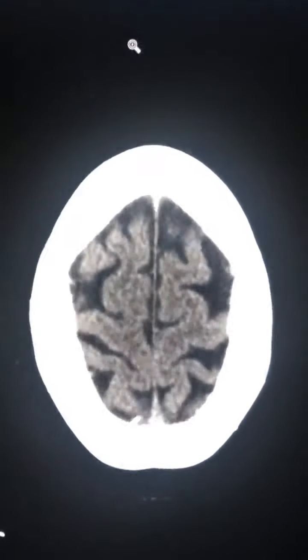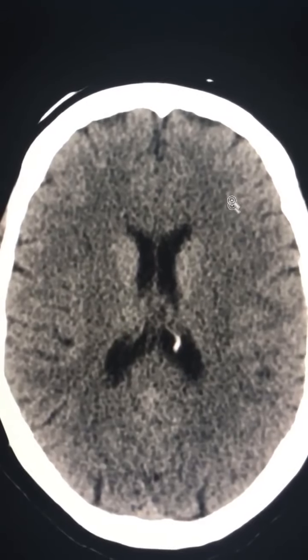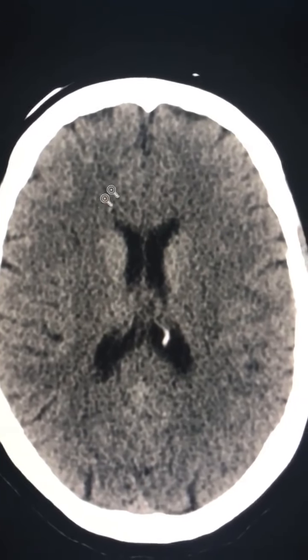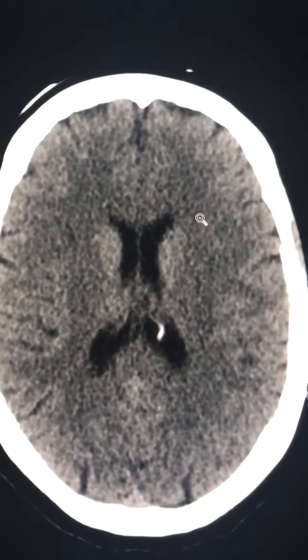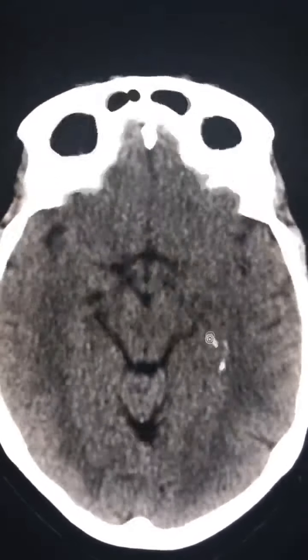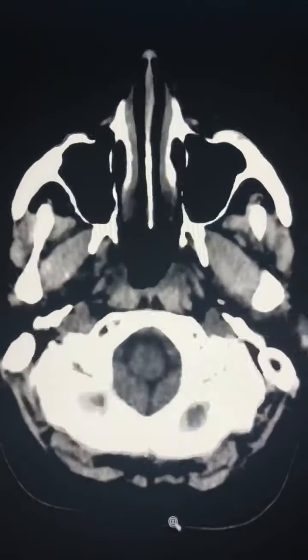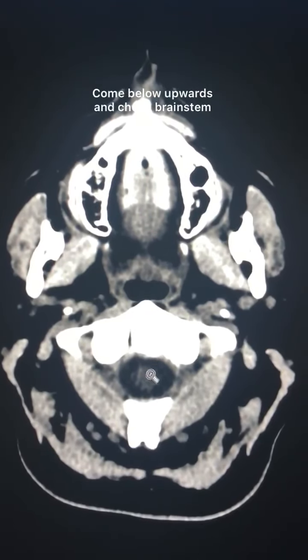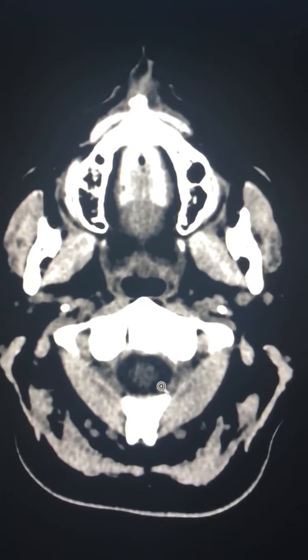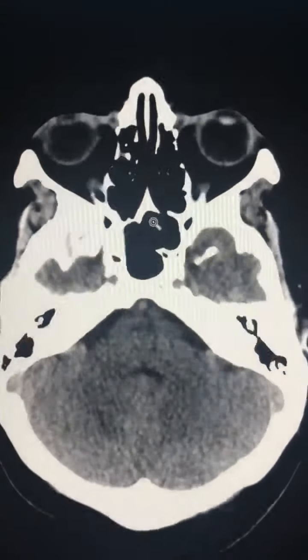Look similarly at the left cerebral hemisphere while you keep looking at the sulci. There should not be any effacement. Look at the gray white matter differentiation. Keep looking, go down, look till the bottom. When you have gone down to the maximum, look at the spinal cord or brain stem, and then slowly start coming up and keep checking the brain stem.